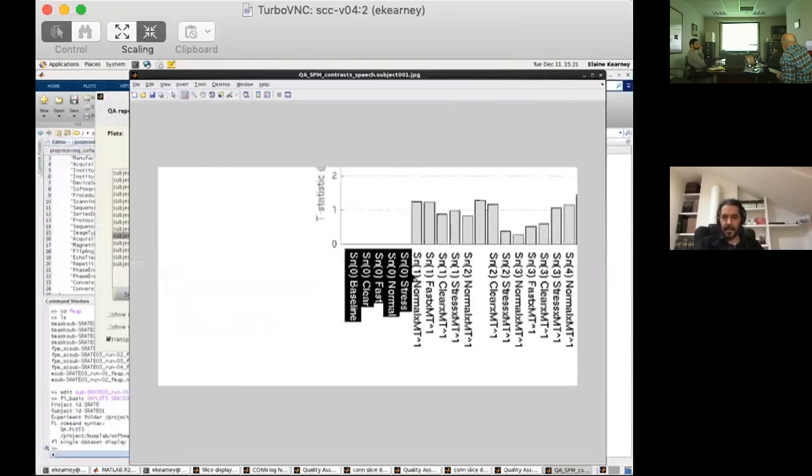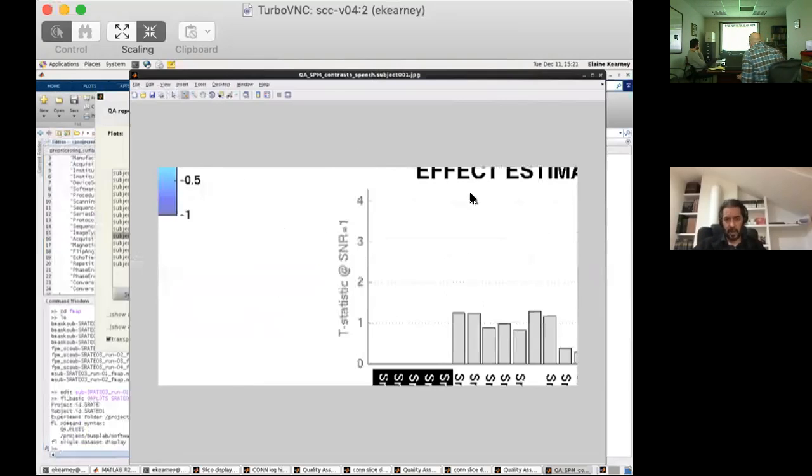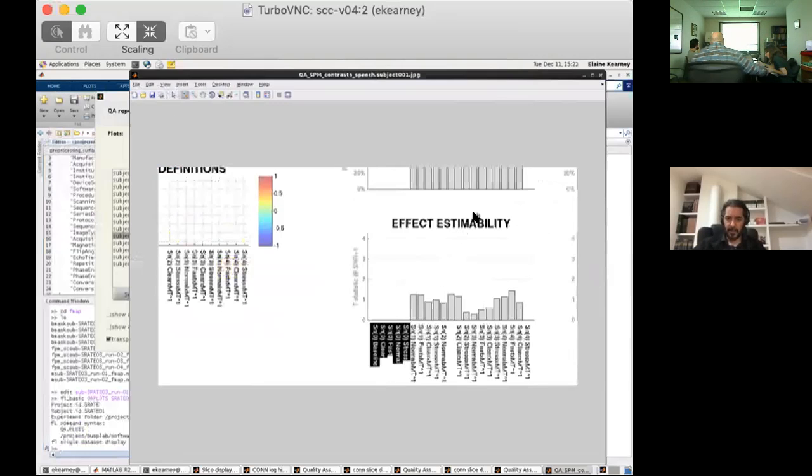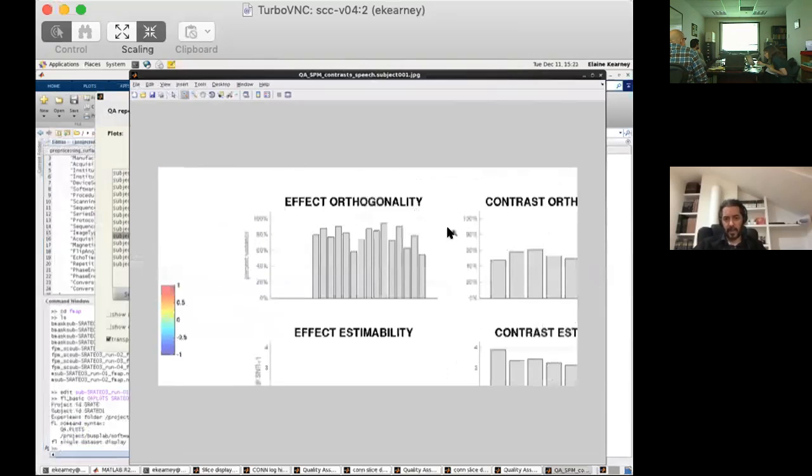All right. Actually, can you look at the orthogonality measures as well in the top? So in the plot that is above this, you should also look at the orthogonality measures for the same thing. If that is lower, then yes, that also seems to support the same thing. So if you see that the orthogonality is lower for the same effects where you are also seeing lower sensitivity, then that has to do with the things that you are trying to estimate not being orthogonal to everything else that you are trying to estimate.